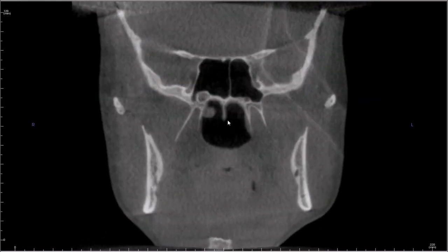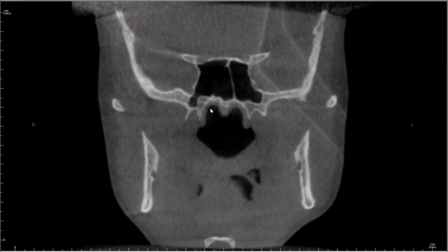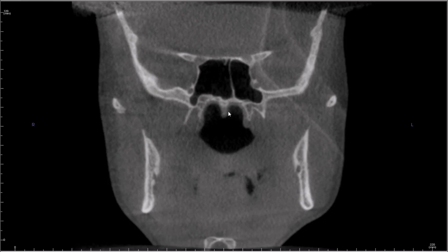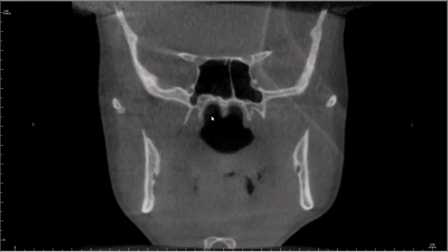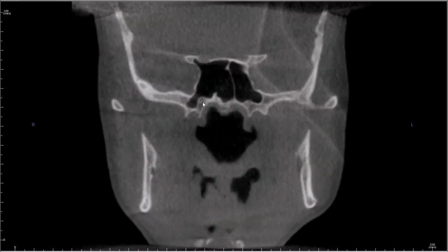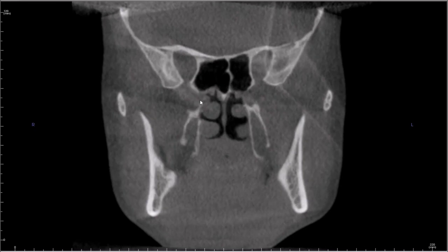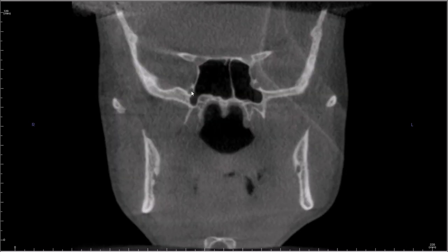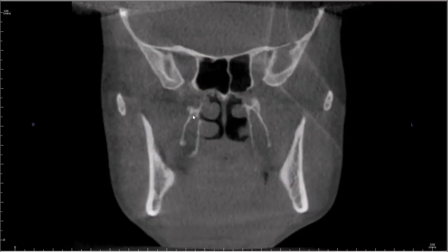So on her, the foramen rotundum are not very obvious, but they're there. When you look for the foramen rotundum, they'll be lateral to the sphenoid sinuses. And you may see these little foramina that you want to call foramen rotundum, but they're not. Those are the Vidian or pterygoid canals. The way I tell the difference is, first of all, they're more inferior, but they also seem to open up right in the center of the pterygopalatine fossa and right in the area of the pterygoid processes. Whereas the foramen rotundum open up superior and lateral to what I envision as the central part of the pterygopalatine fossa.